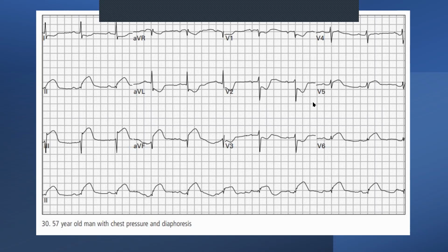So they're quite narrow. The QRSs follow every P and they're quite regular. So except for the first degree block, we basically got a regular rhythm. And then once we start looking at the rate, let's try and work that out. Normally you just find this at the top of your printer, but we work it out the old-fashioned way.